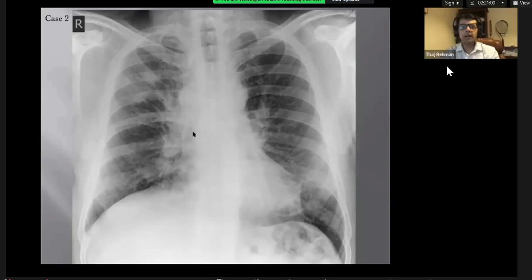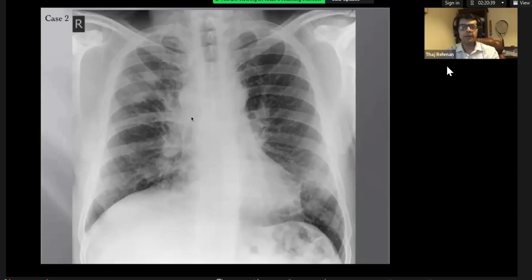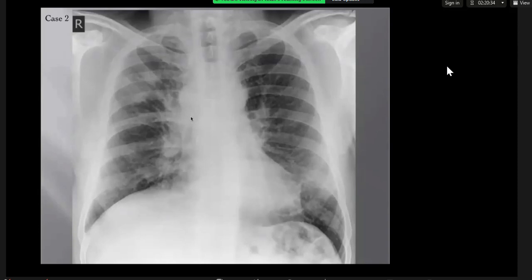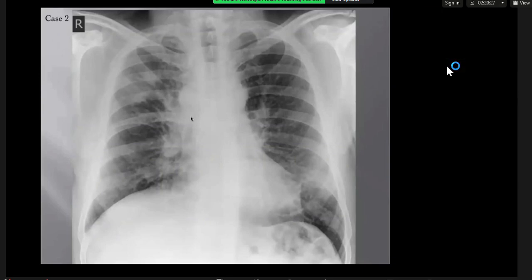And what about the hilar and mediastinum? So the right hilum looks probably a bit higher than I would expect. It's more equal and in level with the left. Can you see the hilar point? What is hilar point? Where it all sort of converges and forms a sort of angular line. Yeah, but I can't see it clearly on here.